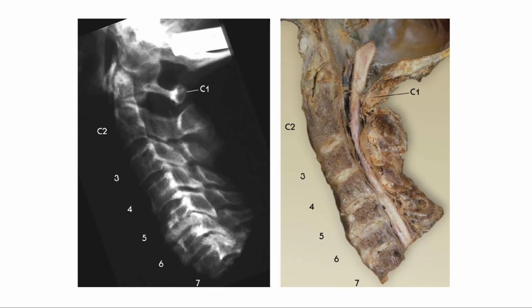Okay, here's a cadaver radiograph on the left, and then there's the actual cadaver on the right. And it's showing you, if you look closely, look at this degeneration. So there's a disc height. Now look at this. Loss of disc height, loss of disc height. Now if you go over here, what's going on? Look at that nastiness. Look at all that degeneration, pain and inflammation from abnormal motion, abnormal position.